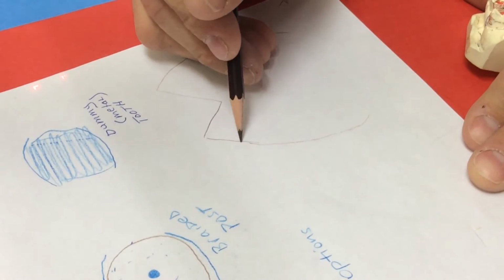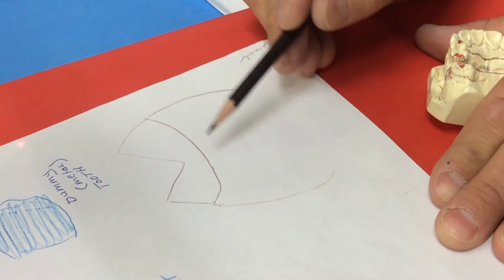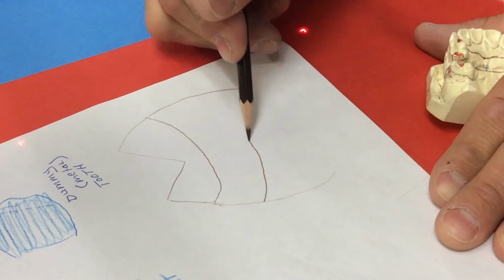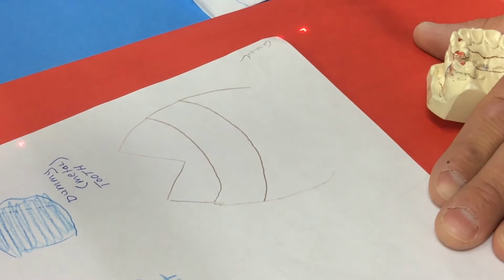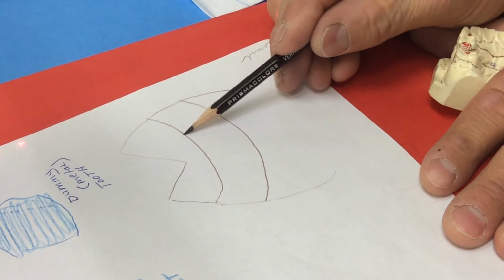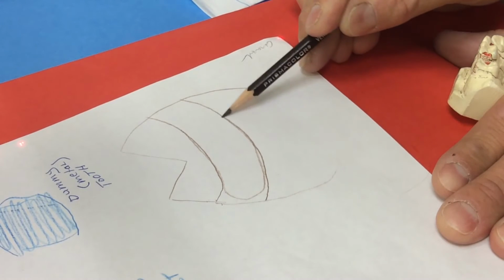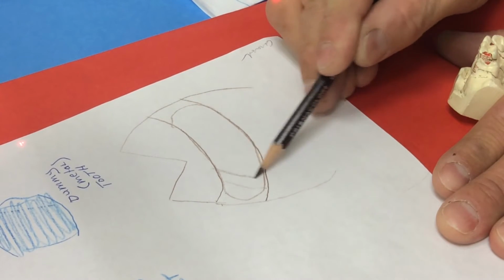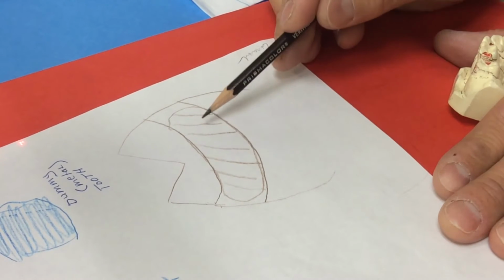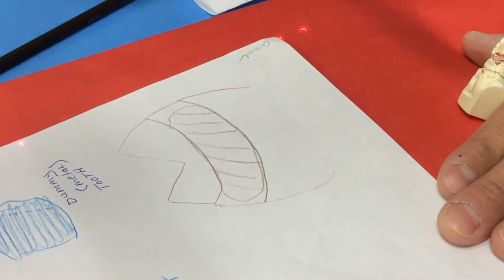Okay. If we have a tooth and we survey it out and our height of contour is clear up here, and I need to put a clasp there, so I need my height of contour down here. I'm going to first draw the height of contour where I would like it to be. I'm then going to indicate that from the one that is wrong down to here, I want to change it. So I draw it where I want it, I indicate where I want it, I indicate where it is, and I indicate with the hash marks that I want to lower it.